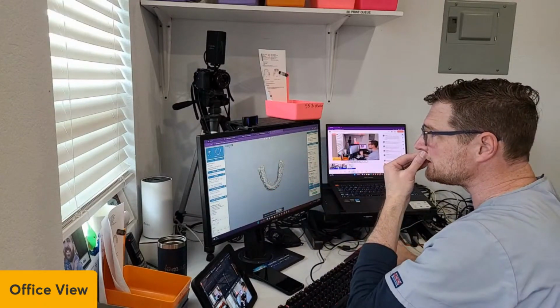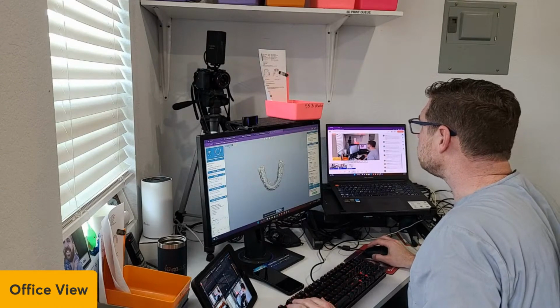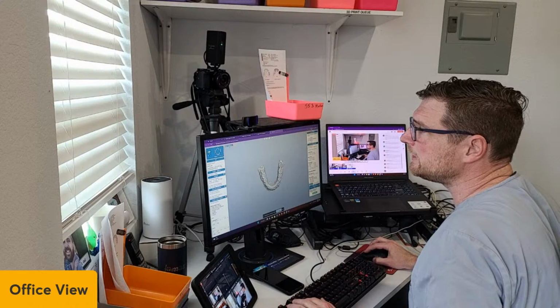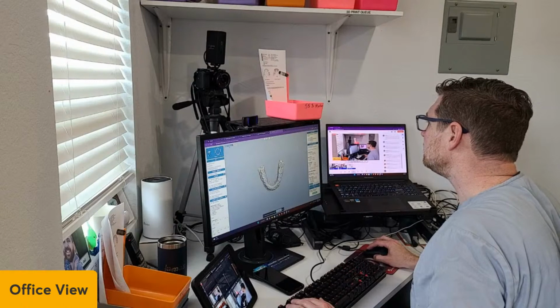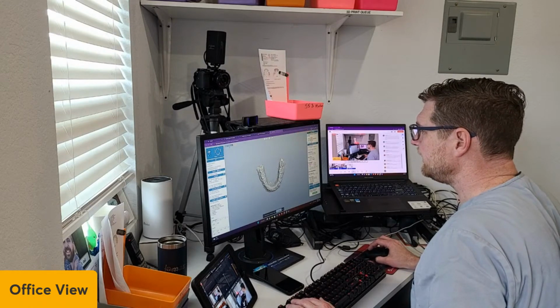So let me do my little blurry thing and select this name and this name, the whole thing. Okay, so let's turn that back off. Okay, so now we are ready to go.